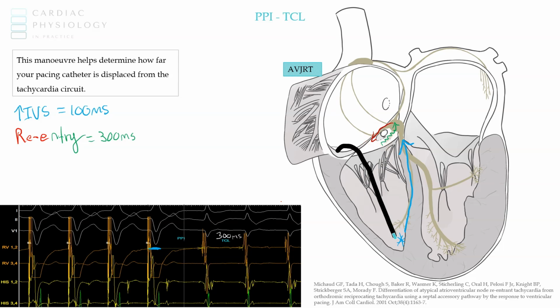After we entrain tachycardia, we'll get a depolarization wavefront that depolarizes the ventricles. Eventually it will depolarize the myocytes beneath the RV catheter. That will take some period of time as it travels down the interventricular septum in this case. So let's say 100 milliseconds once again. And our re-entry part would be this part of the isoelectric line. Once we get depolarization at this level of the RV catheter, that's when we'll first get our EGM.